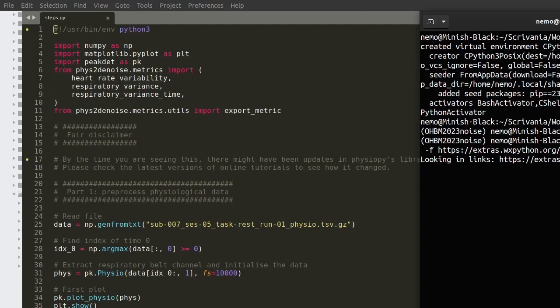I found online that the best way to do it is using pip3 install no cache and then getting the link directly from the WXPython website. In my case, because I have GTK3 and I use Ubuntu 20.04, this is what I want to use. So it's pip3 install no cache, and then the -f is just to get the link to a direct website and not PyPI, and then my link is the one that you see here, with the extras: WXPython, WXPython 4, extras, Linux, GTK3, Ubuntu 20.04.